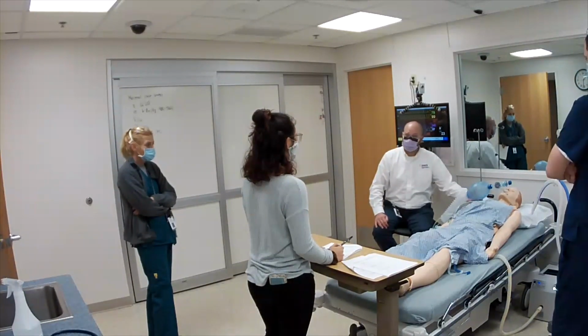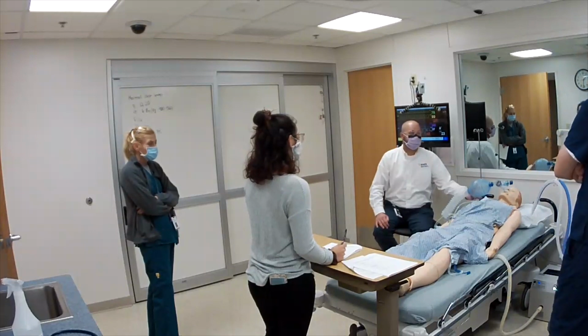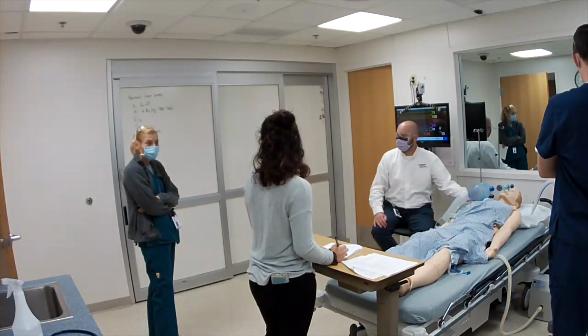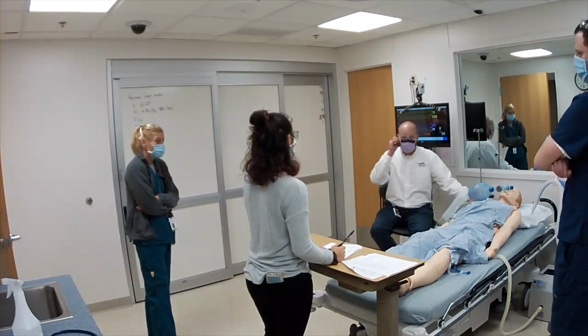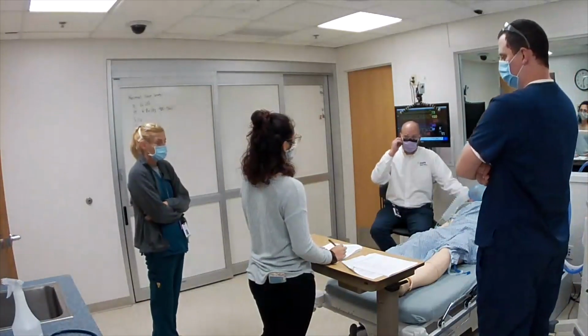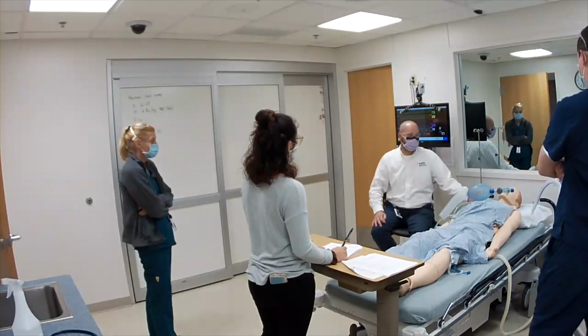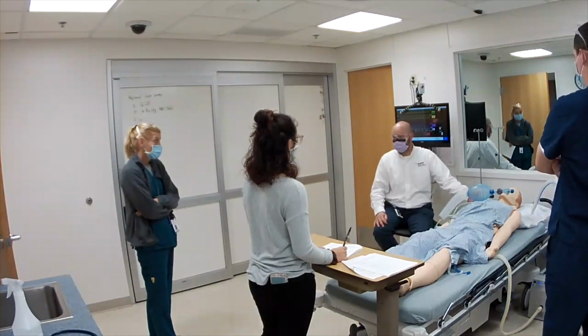Okay, what else do we need? I time. Okay. I time? So what's normal for I time? 1. About a second in, right? Okay, what's next? T-pause. What's T-pause?